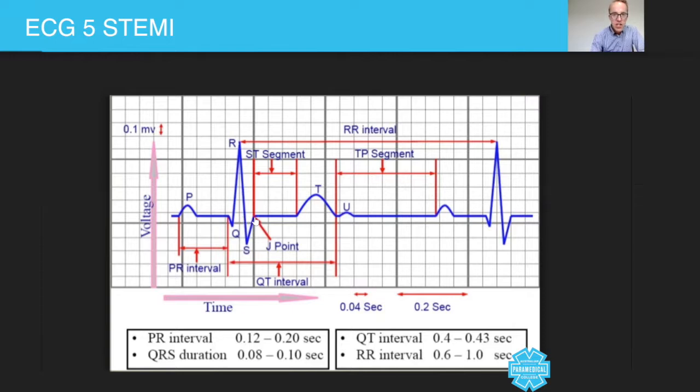On every ECG, you will see this thing called a J point. Here it is on this side, here it is on this side. Now, the J point just refers to that little area there. So in other words, whenever you use those terms, J point, or somebody else uses those terms, it's always only ever referring to that part there.